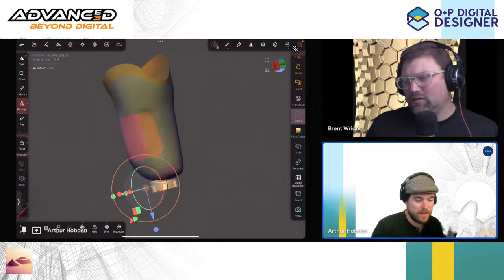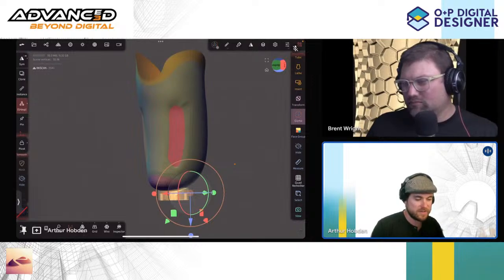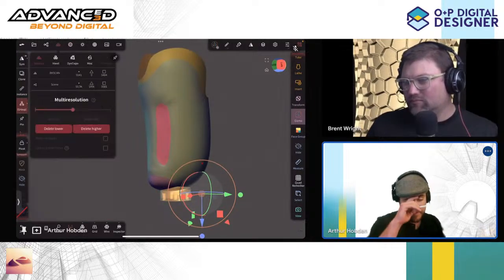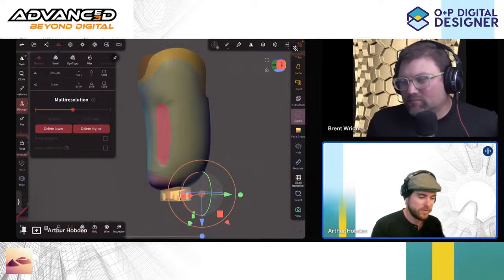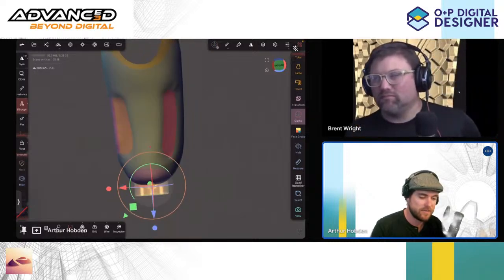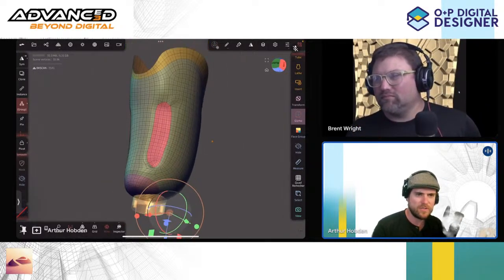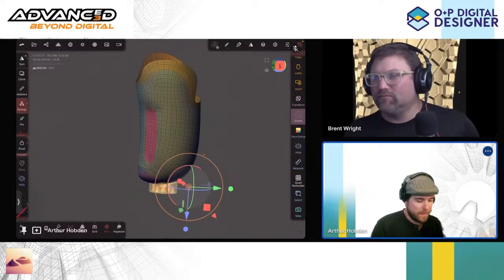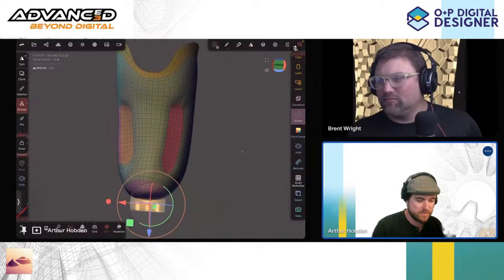It is much easier on quad meshing to manage your quads if we do a version based off of what I used to teach, where you would actually just draw out bands and control the UVs that way, because right now it flows and wraps right around these shapes, and that can give you some weird intersections. But do you feel like this mesh will give you any issues on your side? Yeah, no, I think that should be fine. Okay, great. All right, so we're aligned. We're ready to export. We're smooth.